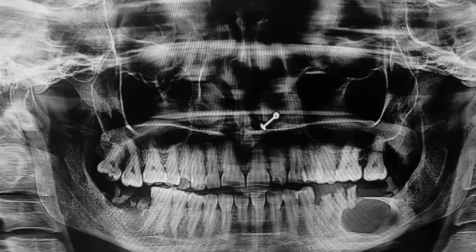Moreover, when I look at other bones, there is no other lucency identified within the mandible. Maxillary sinus and rest of the structures appear unremarkable. So, concluding my findings, I'm looking at a lucent lesion which is arising from the root of the molar tooth. And what is the next step? What should we do next?